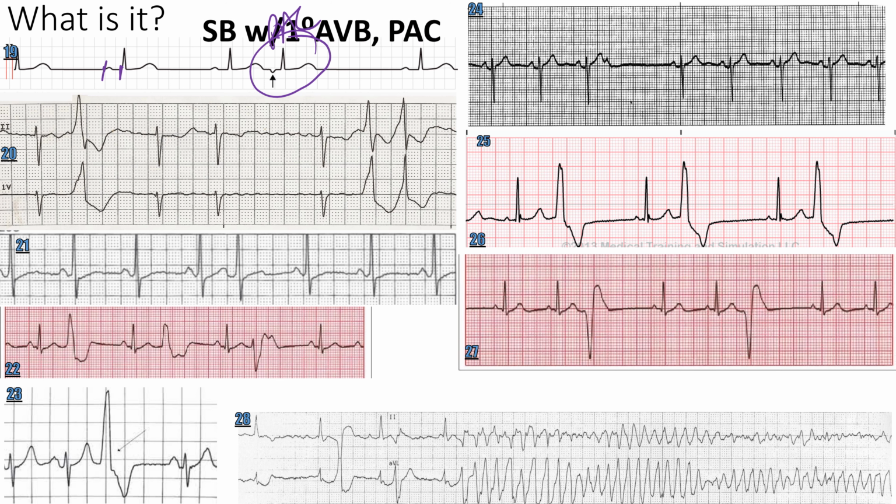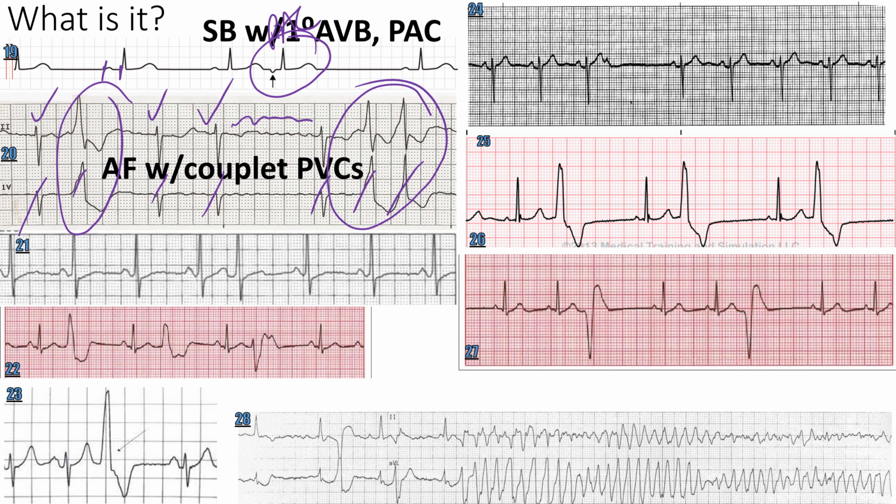Let's see what we got here. Yep. And then next, our normal intrinsic rhythm is a narrow complex, and they got this huge pause here. So that looks like some AFib in there, because those aren't really P waves to write home about. And I got a little couplet right there, and I got a big PVC right there. They look different. That's not great. So I got AFib with a what rate? 1, 2, 3, 4, 5, 6, 7. AFib, rate controlled with some PVCs. A PVC and a little couplet as well.